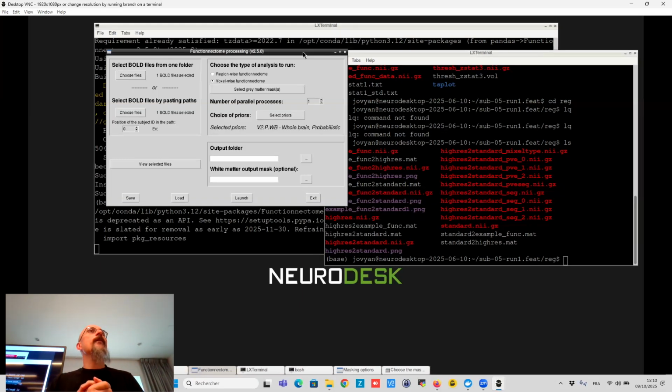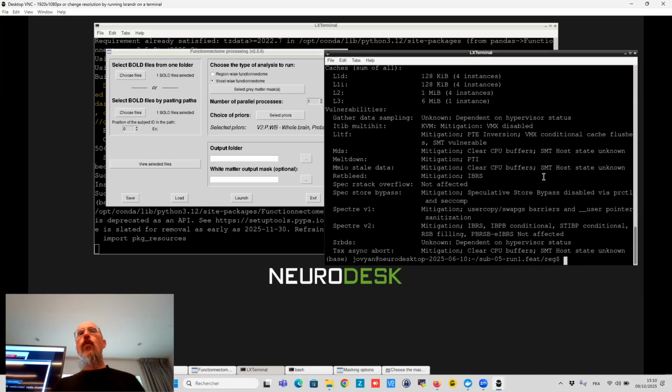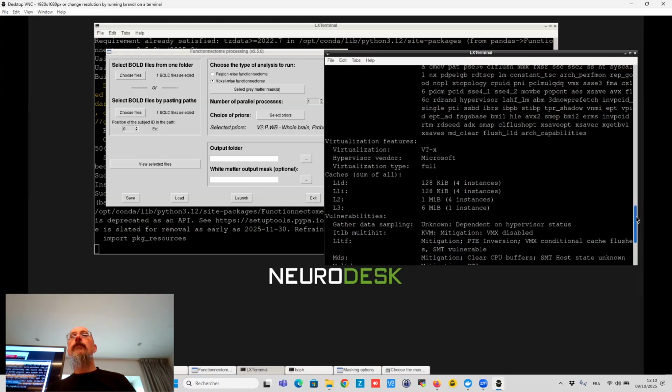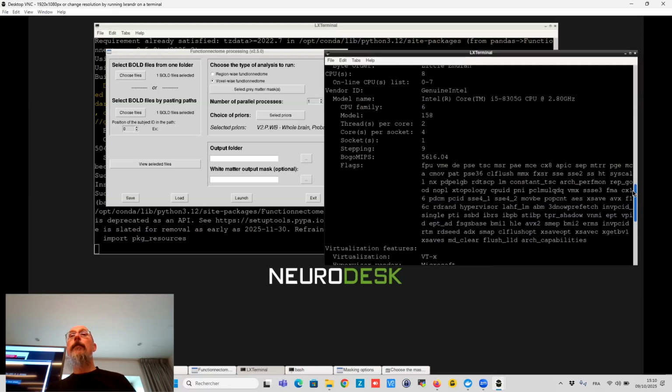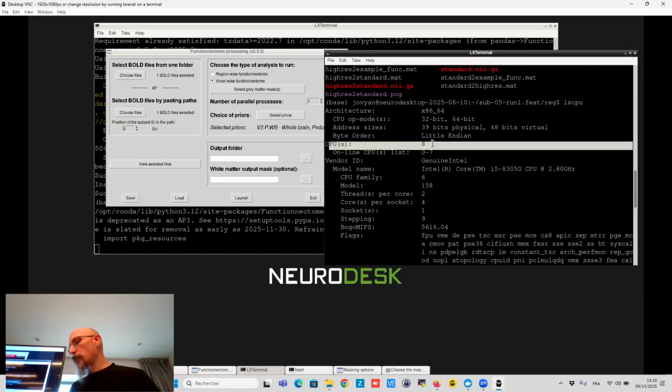It's a good question, because sometimes you don't know. So in a terminal, you know ls, you can do lscpu. It will give you all the CPUs you have in your computer. So for example, here, if I go up, yes. It gives me eight CPUs. So you can see the number of CPUs you can use. So you can take this number and put it here. Okay.